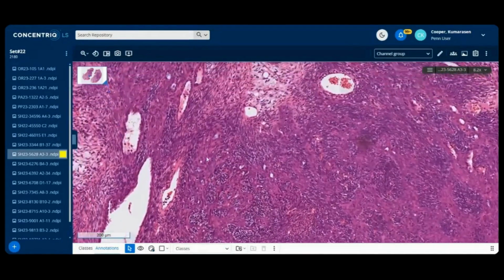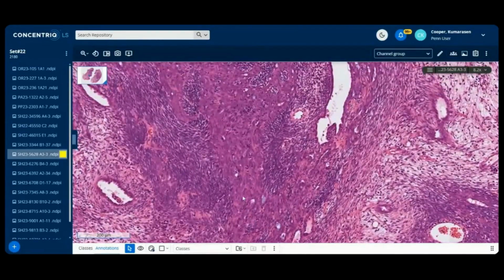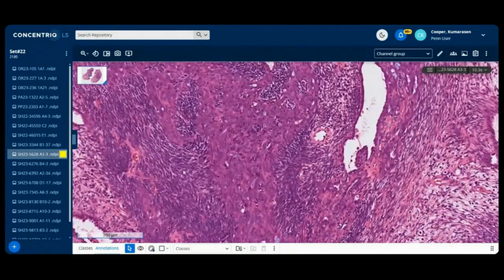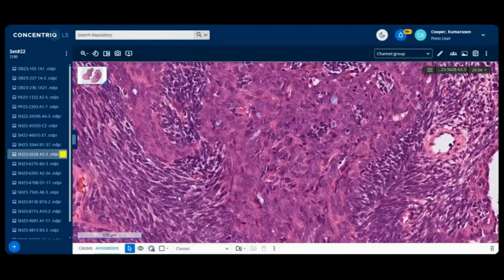And the early comments of biphasic synovial sarcoma are spot on and accurate. And here you can see the biphasic components with the spindled, hyperchromatic, overlapping nuclei. When you read the old books, they used to talk about these ice cream cones overlapping each other. I don't know if anybody talks about that these days, but in comparison with fibroblasts and smooth muscle nuclei, which are more cigar-shaped with rounded edges, and then the pointy fibroblastic ones as well.